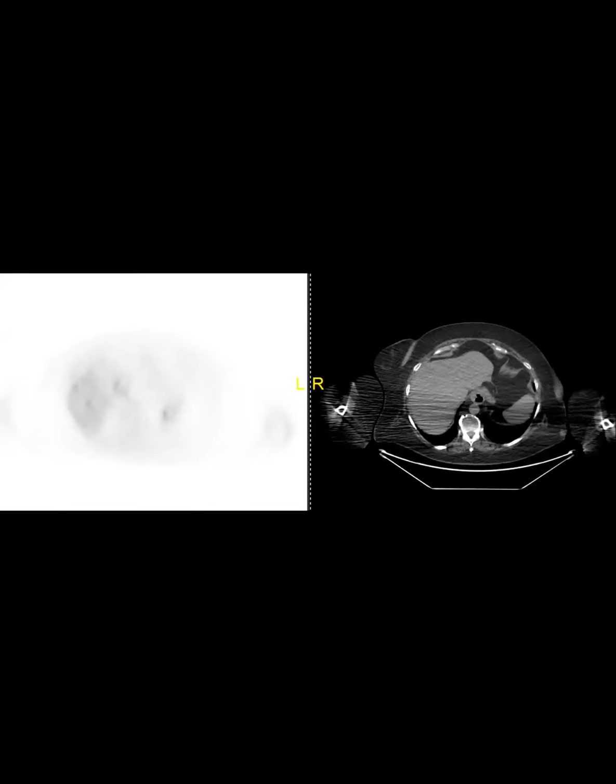Screen? Yep. All right. So this was an interesting case. This patient was referred to Sloan for metastatic disease of unknown primary. This was the salient PET from an outside institution. You can see a bunch of little areas of hypermetabolic activity in the liver.